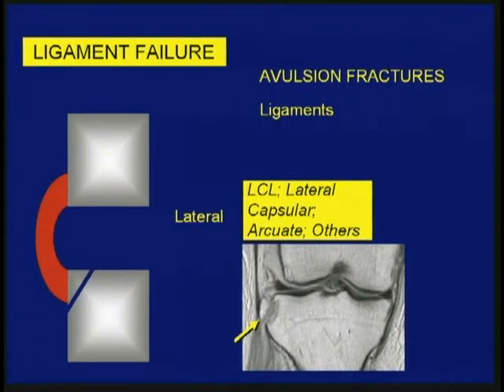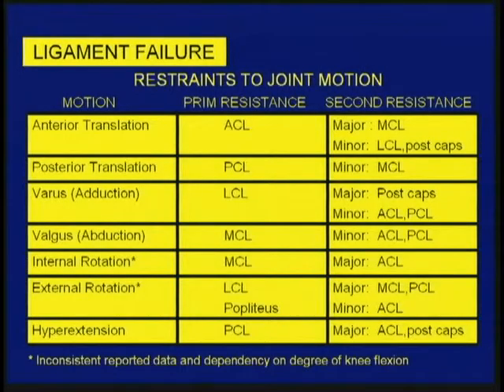There isn't much marrow edema with it, so you might miss this unless you had a plain film to help you. Now, this is a busy slide, okay? I realize that's the bad news. And also the bad news is that it's the most important slide. So let's work our way through this.